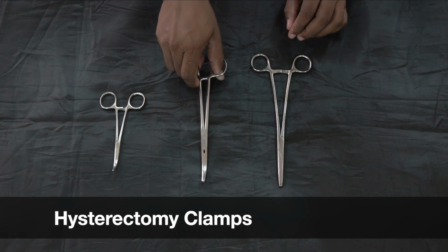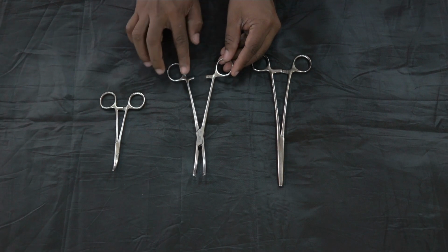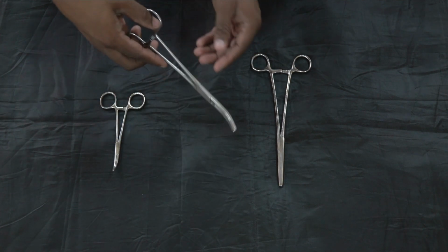Another type of clamp again has a handle with a lock, straight shaft, but the jaw is curved.